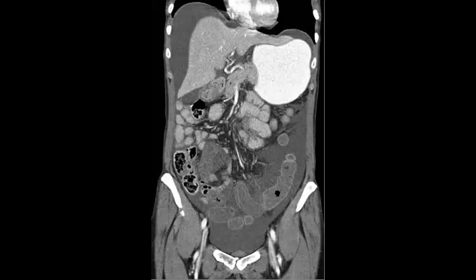And you can see in the left iliac fossa, yes Nermeen, nice, there are edematous or non-enhancing bowel loops compared to the other bowel loops. I mean, if you compare them to other bowel loops, you can see that they are not very enhancing. And the most important, the vessels going to these bowel loops are not enhancing compared to the mesenteric vessels. Yes, these loops, perfect.